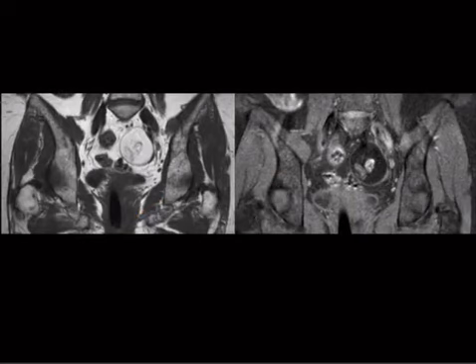Okay, so gamesmanship, guys. Gamesmanship with any of these MR-type questions. First thing you should do is figure out what sequence this is. We can see that we got a lot of fat, bright fat here, even though we don't see a bladder. And technically, fat can be bright on T2 also, but it really looks like a T1, right? The marrow, it just looks like a T1.